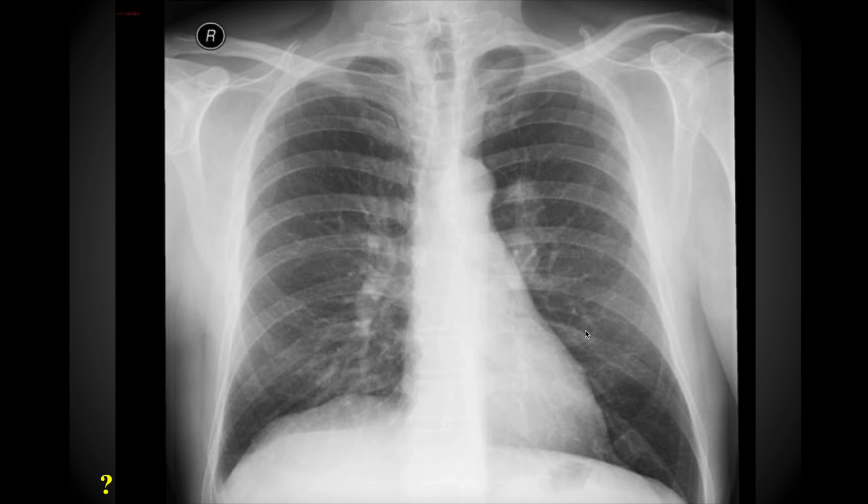We're going to walk through a number of pathologic conditions to help reinforce some of the thoracic anatomy that we've discussed. So first off, I wanted to start out with this chest x-ray and give you just a moment to try to look at it to see if you see anything abnormal.